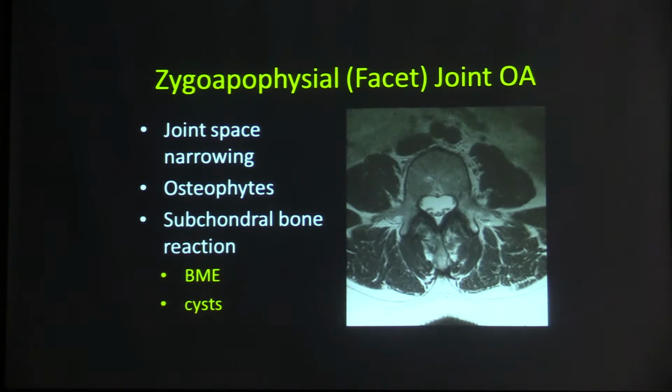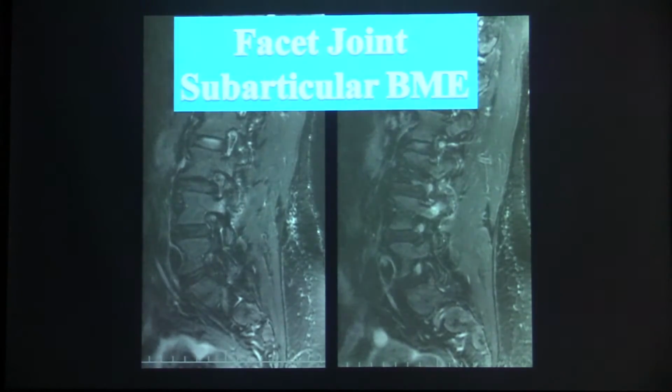Osteophytes, these marginal osteophytes, and then some kind of subchondral bone reaction, which is often a bone marrow edema, or if you work in rheumatology circles, bone marrow lesions, where these flame-shaped areas of bone marrow show up and can turn into cysts, subchondral cysts, which we're more familiar with. So in order to detect these best, I think it's imperative to have a fluid-sensitive sequence such as a STIR or T2 fat-sat. In the US, the protocols are very variable, and when I talk to surgeons and to pain management doctors, it's much to my surprise that a fluid-sensitive sequence is not included routinely in their spine imaging.